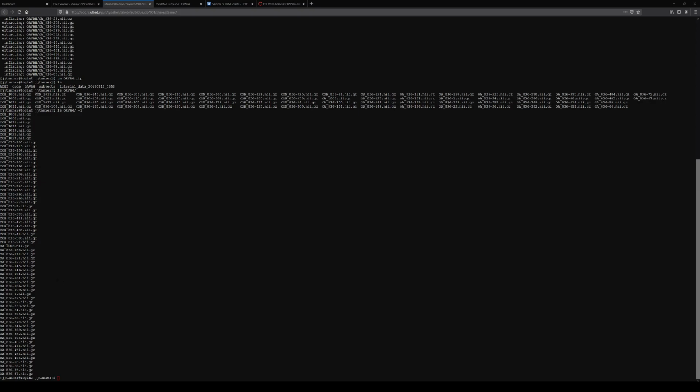In that case, you wouldn't have to have some prefix. You could have a prefix, but you could just have their IDs, and as long as everything's sorted in the appropriate manner, meaning the order that this is sorting is matching the order that you're pulling the data in from a spreadsheet or a database, then that's fine.